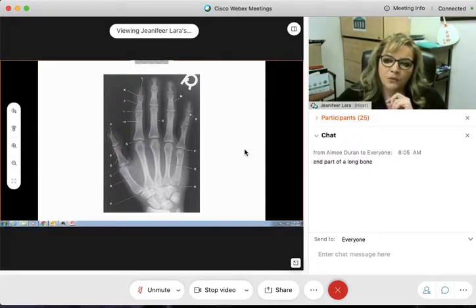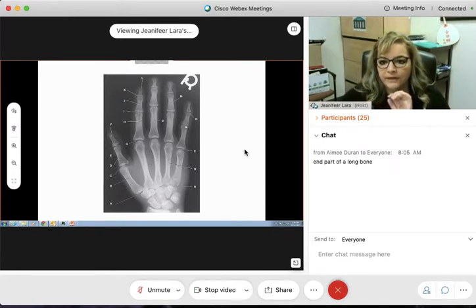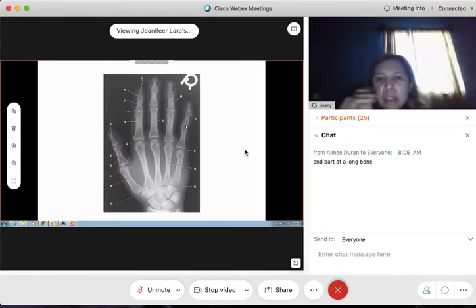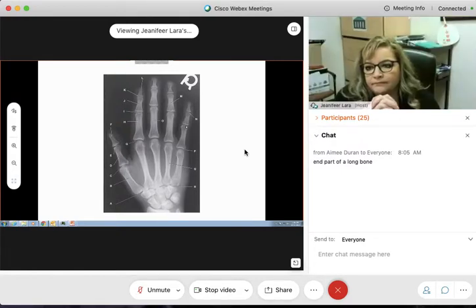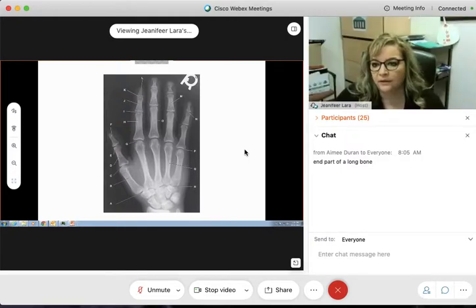All right, Wani, what is this that I'm pointing at? I don't see where you're pointing, Miss Laura. Oh, you can't see right there? I'm looking at the space. PIP? Okay. There's about four of them. Is it the head of the... No, I want the PIP, but there's about four of them. Wani, is it the fifth PIP, of the right hand, because we see the right, correct?